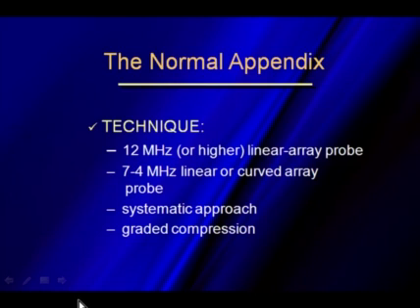Now, talking about the technique, you want to use a high-frequency linear array transducer. And even on patients that are fairly heavy, I'll at least start out with a high-frequency probe. In the second half of this lecture, we're going to actually talk about inflamed appendix and you'll see the importance of using the higher frequency transducer. If I need to switch to a lower frequency transducer for better penetration, I actually prefer going to a curved array transducer rather than the linear array, just because I get a wider field of view that way.